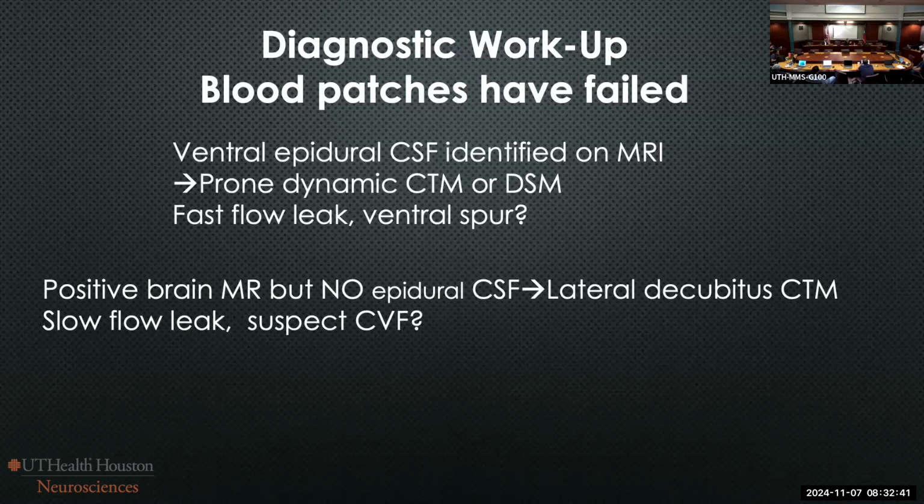85% of them are. So we'll look on the MRI and say, okay, which side has the most Tarlov cysts? Now that's a normal finding, right? So you can't really know that that's a culprit, but in 85% of people who end up having fistulas, it's coming from a diverticulum. So maybe there's a bunch of them on the right-hand side. Let's do the right-hand side first. That's how you decide.